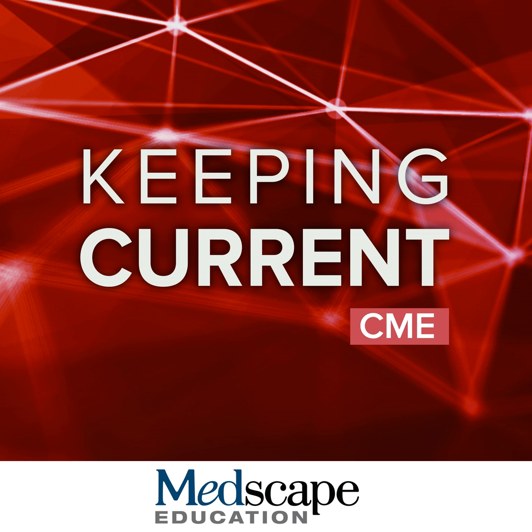So what are the recommendations that I would make for late gadolinium enhancement imaging? You use an inversion recovery technique, and the examples I'm showing are inversion recovery turboflash or inversion recovery SSFP, and I'll show how these are used in practice. We typically inject anywhere from a single dose to a double dose of gadolinium contrast. A single dose of contrast is in fact adequate. You image at 10 to 30 minutes post-injection. If you inject a single dose of contrast, you tend to image earlier at about 10 minutes, whereas if you inject a double dose, you're going to image at about 15 minutes. And late gadolinium enhancement visualization depends on the technique used, the dose, and the image acquisition delay post-contrast injection.